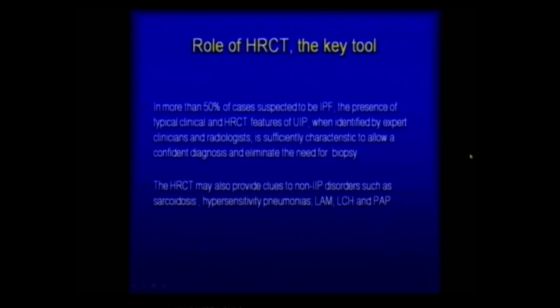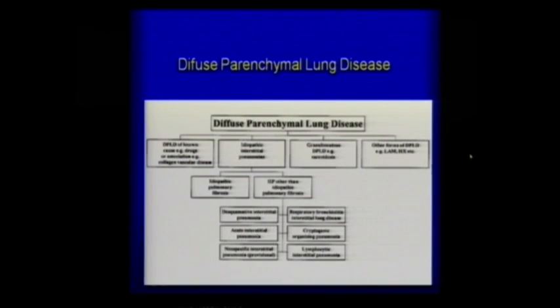So yes, especially the volume one, which encompasses the whole information, is very helpful in straight away diagnosing entities like sarcoidosis and some of the very typical ones like pulmonary alveolar proteinosis, or it is even able to separate entities like histiocytosis, that is Langerhans cell histiocytosis, and even lymphangiomyomatosis. So you are able to exclude all those diseases also before coming to the idiopathic interstitial pneumonias.